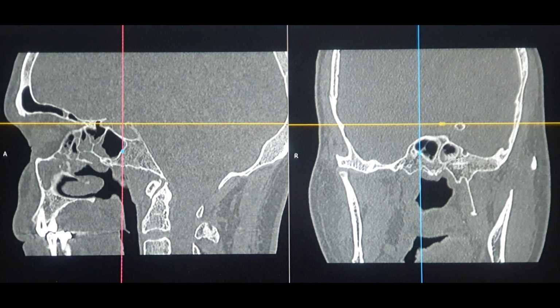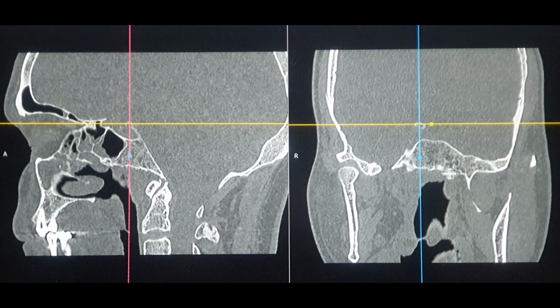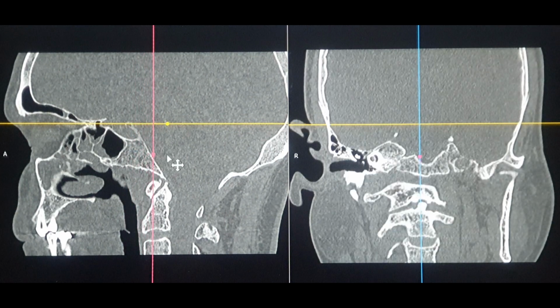So that's the most posterior aspect of the sphenoid. And if you keep on going behind, that's entirely the clivus bone over here. And if we keep on going posteriorly, the brainstem will come over here, the vertebral artery will come over here, and so on, which we can study on the MR angiography or the MRI scans. So I can do that for you in my next lectures if you want. I can teach again the cerebral vasculature right from the neck up to the brain, which I've done in my previous lectures, so you can go and check it out.